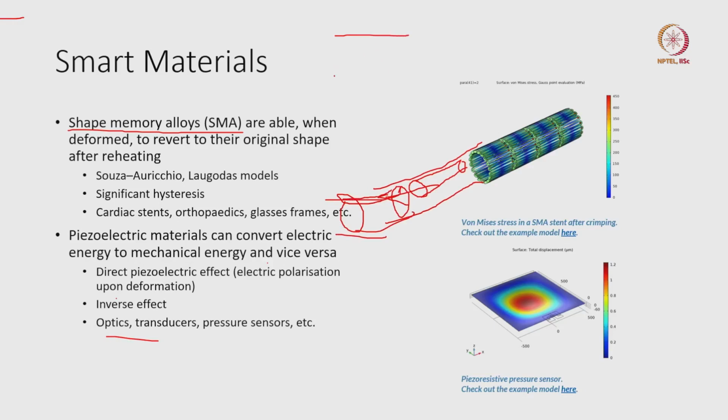So, ideally if this is the artery, you have a certain kind of blockage like this, perhaps because of the deposition of cholesterol, and after the placement of the stent it would look something like this. So, it will get minimized over here, and the positioning of the stent will come somewhere over here. I am just trying to do a side view cross section over here.